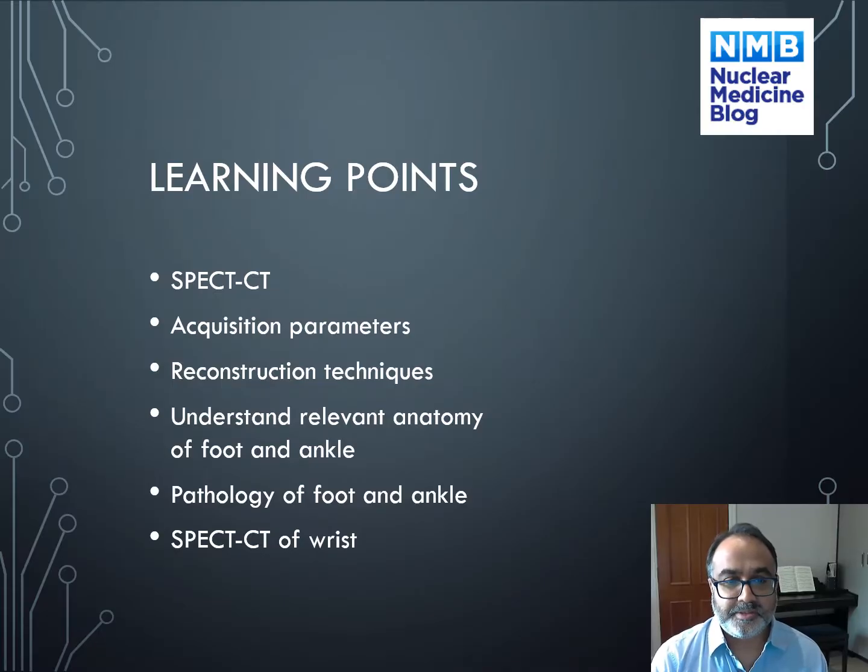I'm going to be talking about using SPECT-CT in imaging the extremities. I'm going to cover the acquisition parameters we use and go through some reconstruction techniques. I'm going to be going through some of the relevant anatomy of the foot and ankle, and I'm also going to cover pathology of the foot and ankle, and I'm going to show you some examples of SPECT-CT of the wrist.